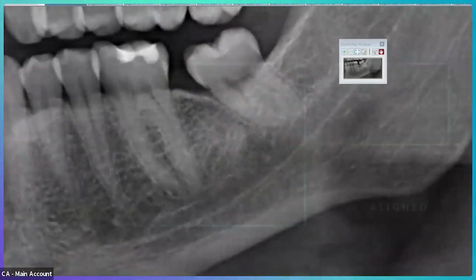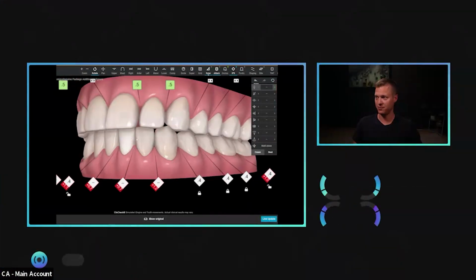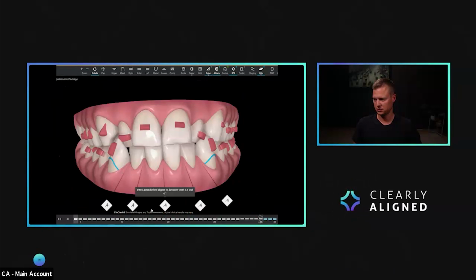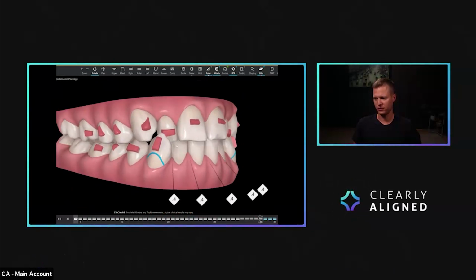But this is essentially then where we're at with our plan in terms of, again, how you can make those modifications and adjustments yourself. Pretty easy stuff. Again, that was just for demonstration purposes. So again, from our initial plan, we're right here. I did change out a few of the attachments.